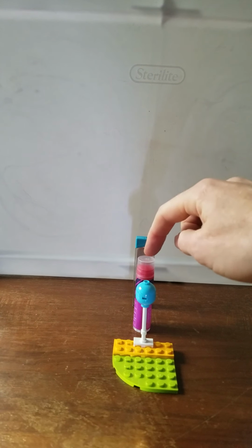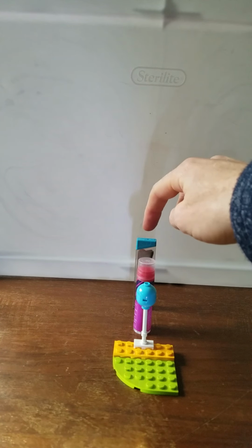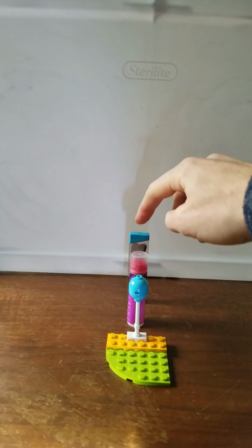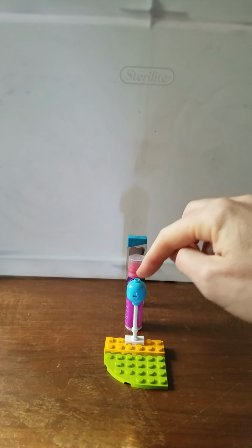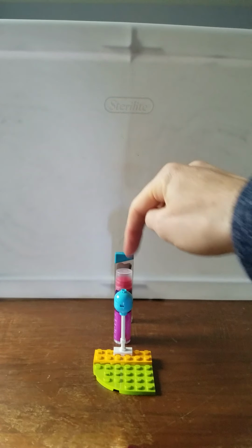Then we have the tooth, and then back here we have something that's lingual. So that could be something like, well, I can't think of anything off the top of my head. But we have something that's more lingual. What I want you to pay attention to is the buccal object and how it moves in relation to all the other objects.